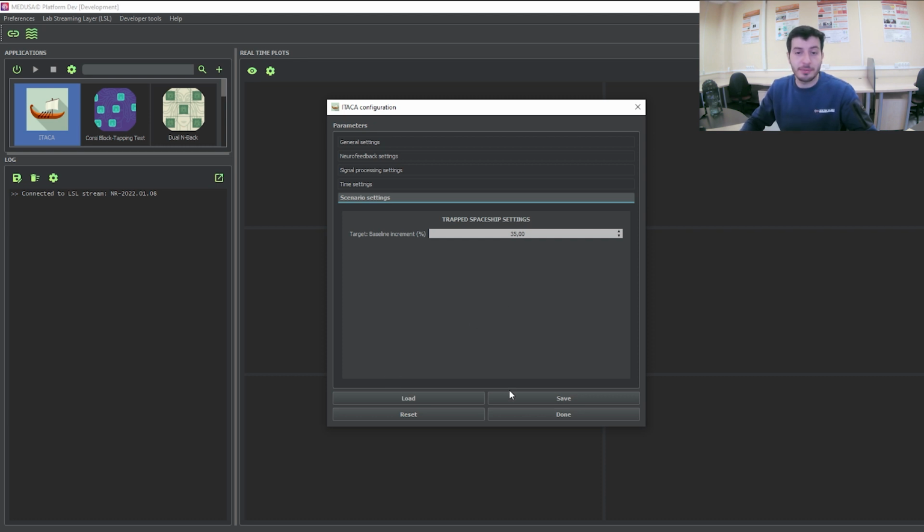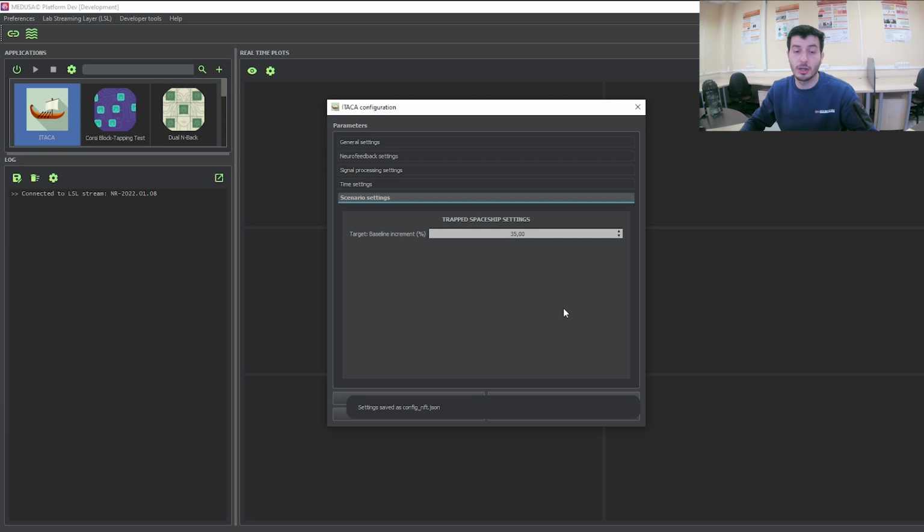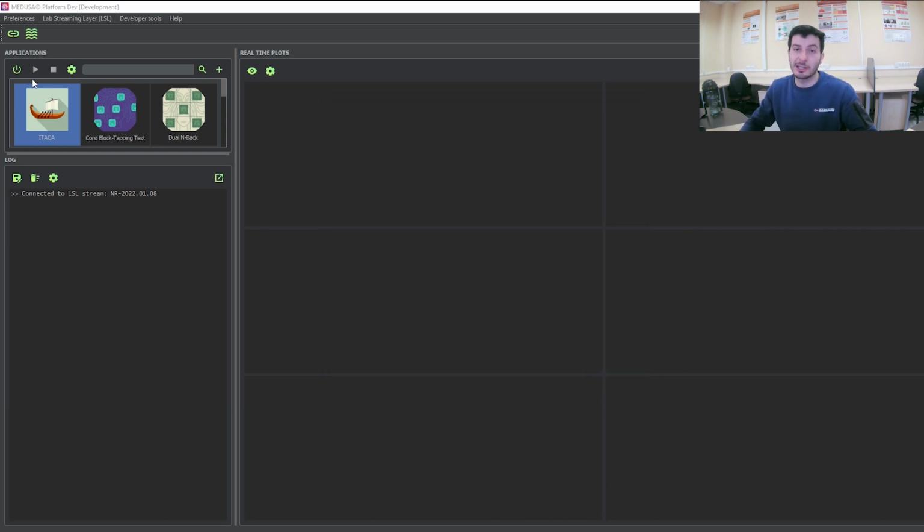We have everything ready. Now we can save the configuration for future sessions. Now, all that remains is to launch the app and start the neurofeedback training.